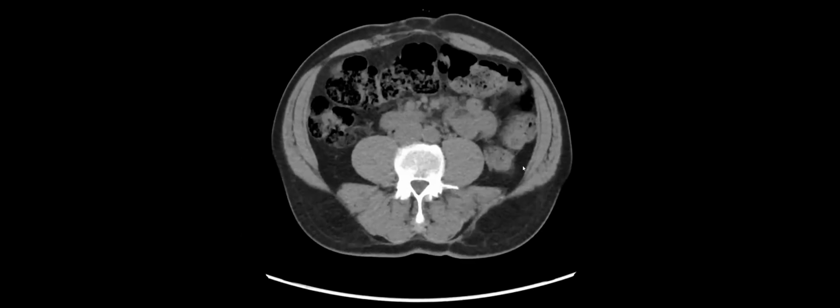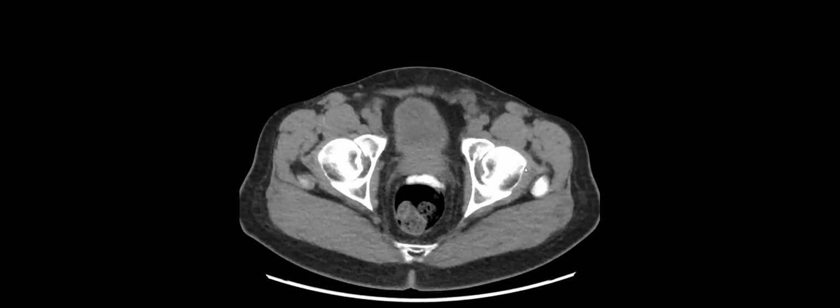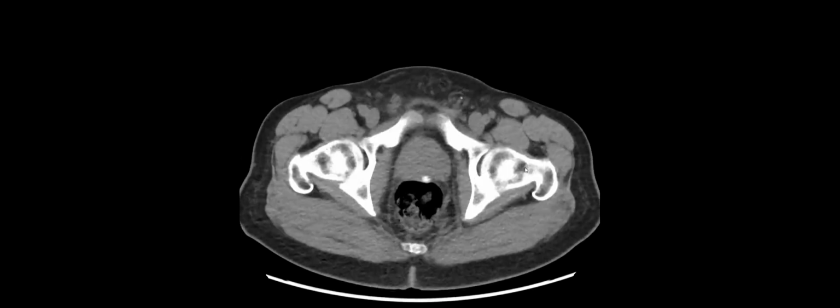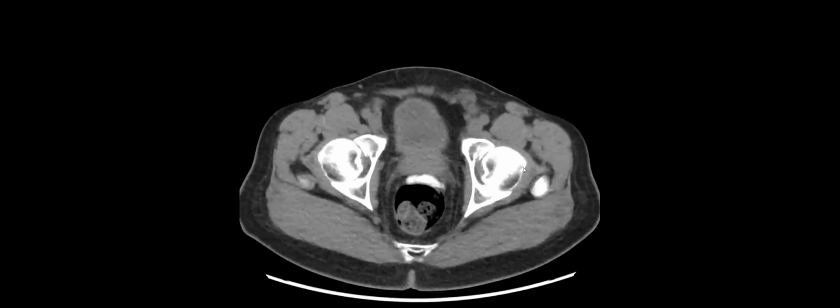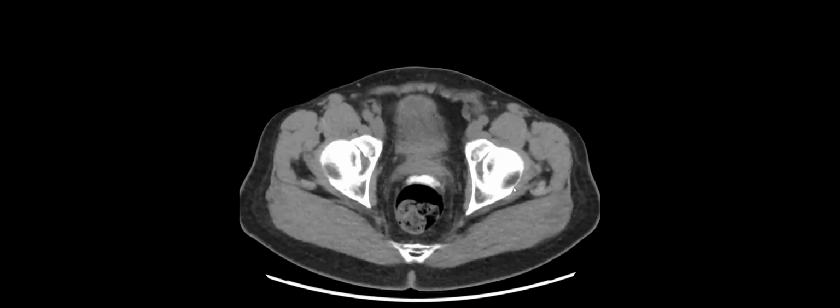Okay, going down to the pelvis. Hydrogel for prostate therapy, to give radiation in prostate cancer. This is the hyperdense variant. Exactly, this is a spacer. Just to show what it looks like on CT, because we often show the MRI. They actually make it specifically radiodense so that you can also see it on CT. It's a really nice example of good positioning of one.